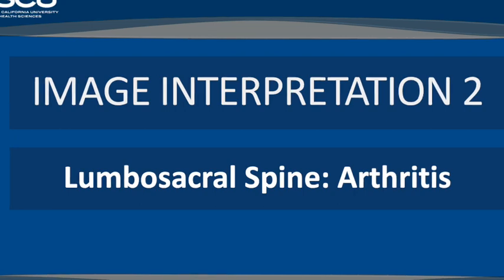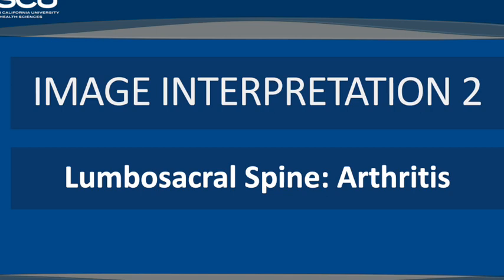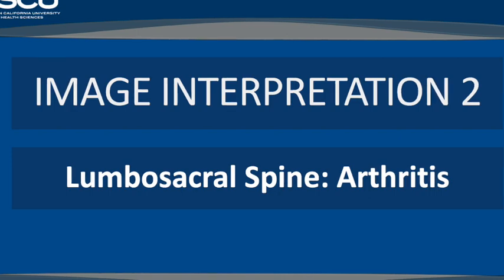of degenerative disc disease. Moving on to other arthritic conditions affecting the lumbosacral spine, we have facet arthrosis, or degeneration of the facet joints. The image on the left demonstrates facet arthrosis, with characteristic features such as joint space narrowing, subchondral sclerosis, and osteophyte formation. The image on the right illustrates Baastrup disease, also known as kissing spinous disease. In this condition, there is an abnormal approximation between the spinous processes, leading to the development of a pseudoarthrosis. While this can occur elsewhere in the spine, it is most commonly observed in the lumbar region.